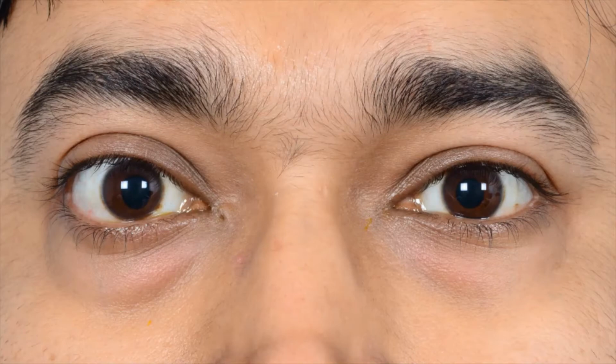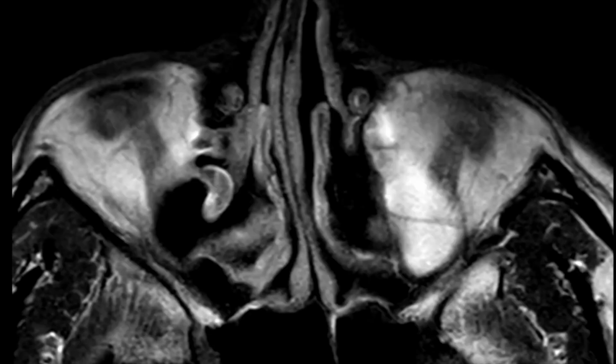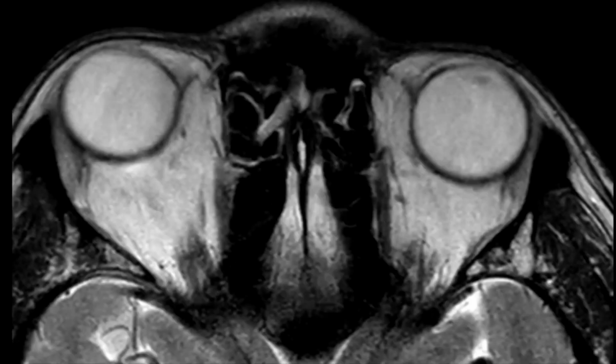As clinico-radiological correlation is mandatory to understand, let's discuss some of the major pathologies that we come across for a deeper and better understanding. Here is a 34-year-old male with right eye axial proptosis and disc edema and choroidal folds. On MRI, a well-defined intraconal mass causing right-sided proptosis was seen, causing compression on and displacement of the optic nerve supranasally.